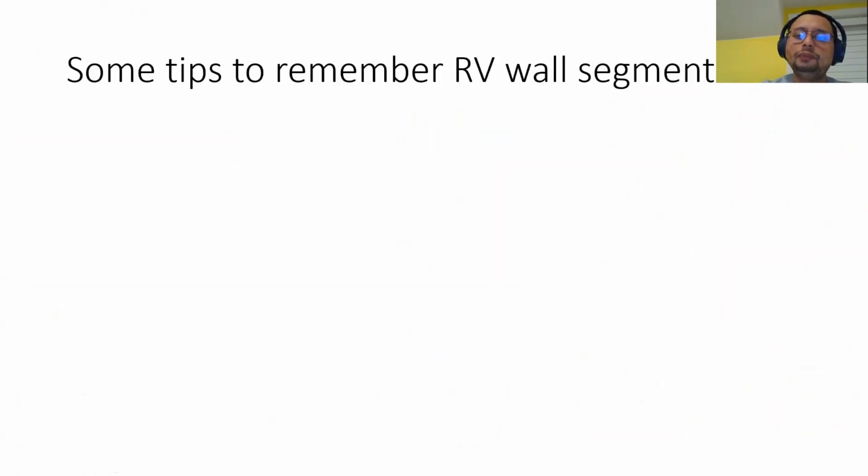Now always when people look at the left ventricle, when they look at echo, they forget the right ventricular wall segment. Why is this very important? This is important because you need your right ventricle for your heart to work properly, because whatever comes out from the left ventricle has to come actually from the right ventricle. And number two, if you are particularly interested in myocardial infarction, and all of us are, the inferior myocardial infarction can involve the right ventricle wall. So you have a phenomenon called inferior myocardial infarction with right ventricular wall involvement.